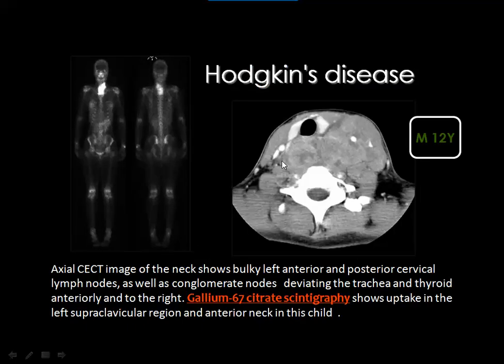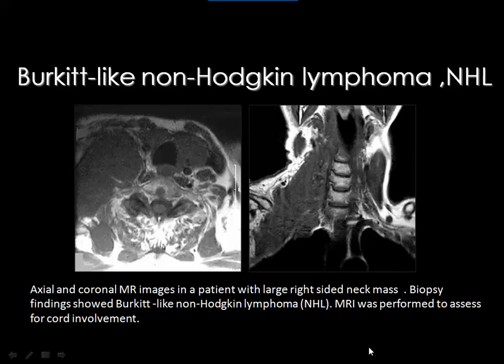And this is a pathologically proved lymphoma. There is a big mass formed of lymphadenopathy extending in the retrotracheal area, and this is gallium-67 citrate scintigraphy, which is one of the specific isotopes taken by lymphomatous tissue, and it was at a time a helpful examination to differentiate lymphoma from other pathologies.